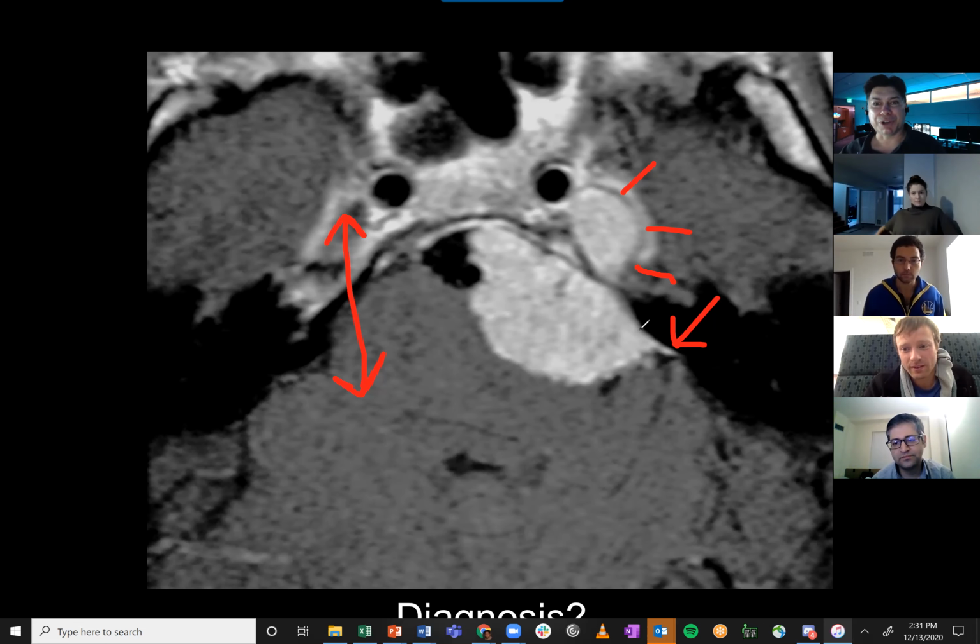We think about a CSF vascular cleft between the lesion and the brain itself. And if they do go over a foramen, in this case the porus trigeminus, the opening of the trigeminal cave or Meckel's cave, it's extending into that area. That's right. So meningiomas can escape the skull if they go through any kind of foramen, like ovale or something else. That's right. Next case.